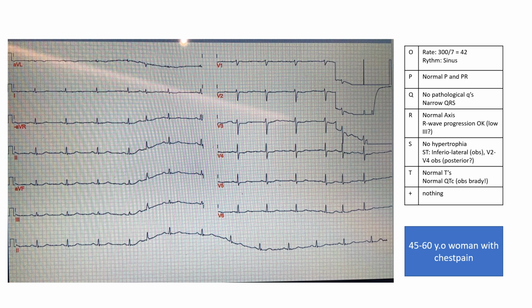I'll directly now go to the PR interval, and it seems like the PR interval is stable. So it's sinus rhythm, I think. There is some noise, and there is a bit of sinus arrhythmia. You may think the QRS is becoming farther apart and then closer in between, but it may be just the noise of the ECG.